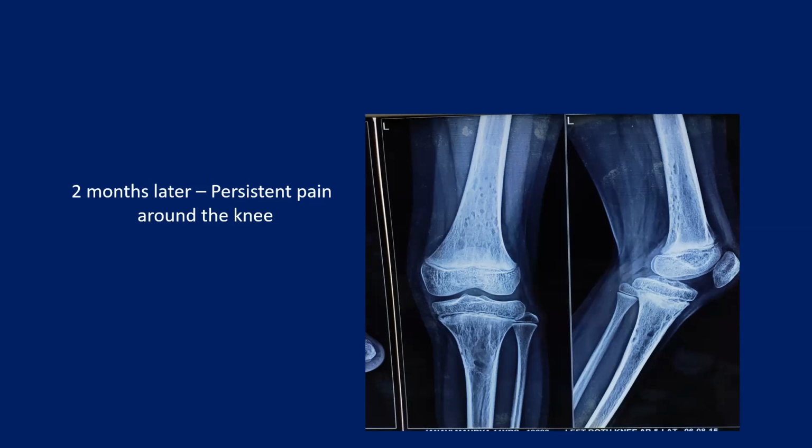Still looking at the previous ankle images as well as the knee images, one possibility which could be is multicentric, some low-grade infection, which comes to my mind. Apart from some systemic illness. Yeah, Ankita, do you have any other thought on this? And we'll show you the MR as well in a moment. Sir, I agree with Ankur, sir. So that would be one thing. The other thing I was thinking of was CRMO.